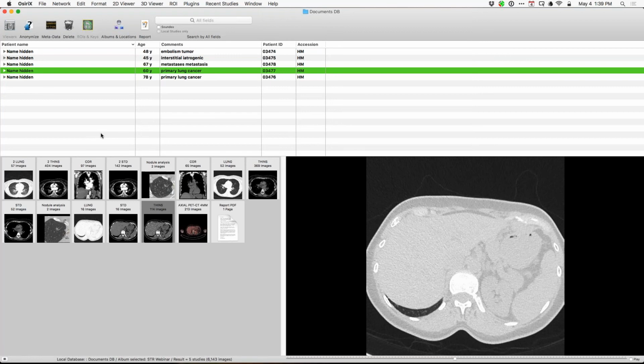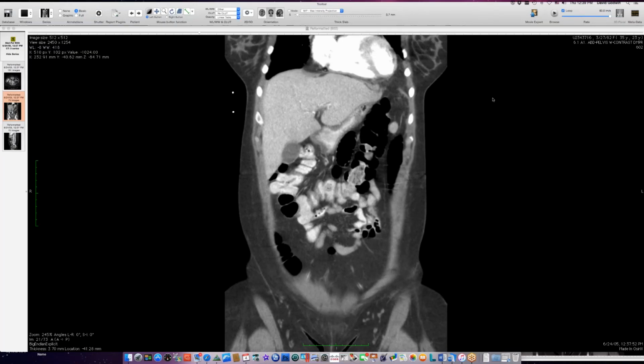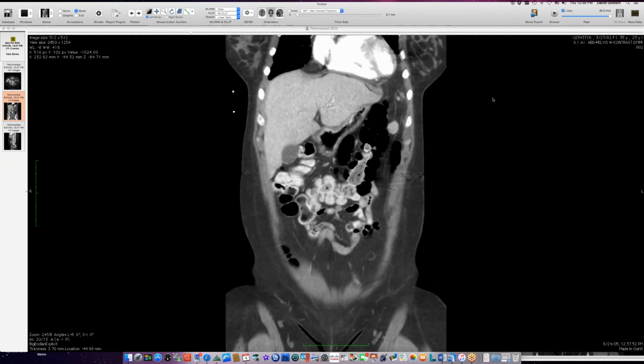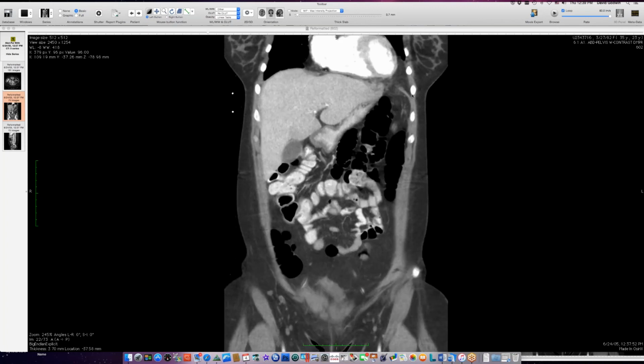Sure, yeah, great. So can people see a coronal view? Yep. So this is a person who had a heart transplant that followed an LVAD. And at this point, you can see this is the transplanted heart, but here's the defect in the diaphragm. Here's diaphragm intact at this point. There's a hole in the diaphragm here where the LVAD was taken out.